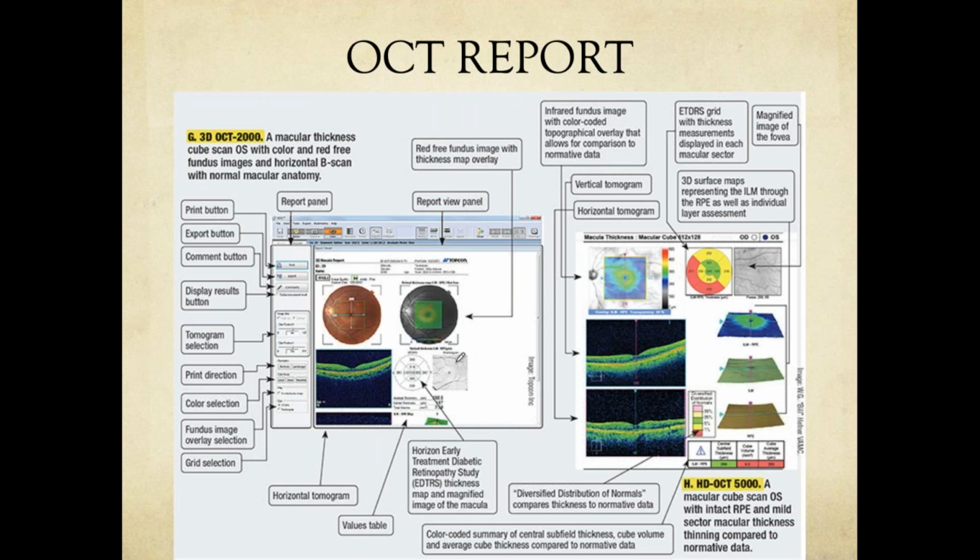But when you do a shadowgram, even the microaneurysms, because the resolution of the OCT is so good, the shadows, because it's a reflection, you see, you're using an OCT, you are sending a signal, and trying to see how much of your signal is getting back. So in that process, the vessels, the microaneurysms, any pathology that is there, tend to cast a small amount of shadows in the retina. Those shadows are caught back by the OCT, and anything like small microaneurysms or small lesions could be highlighted in this shadowgram.